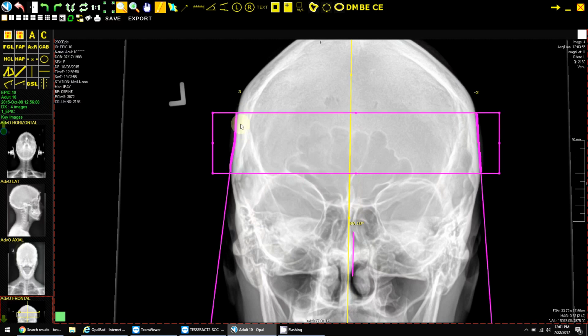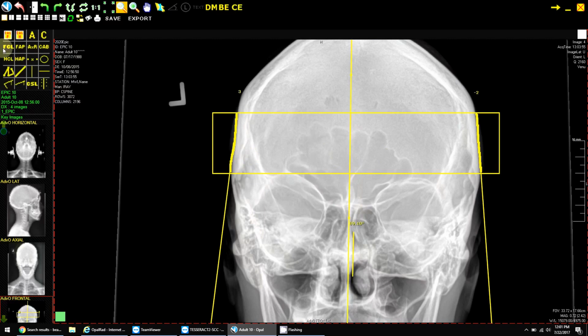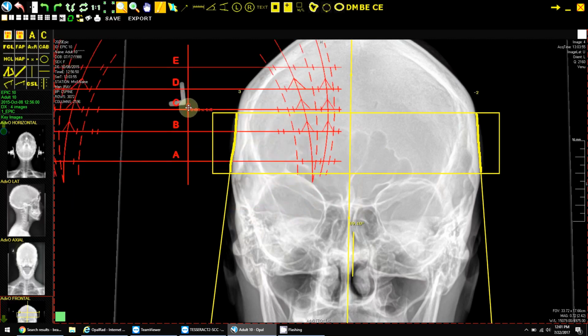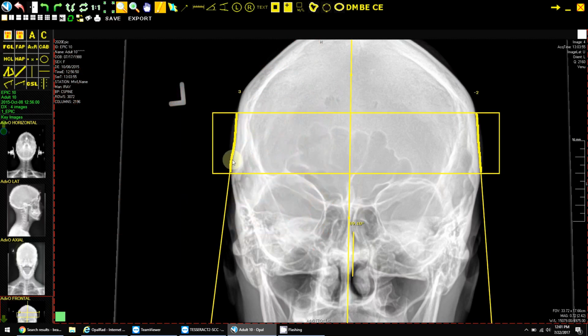You can see with this patient, they have some dents in the skull, and using the old template, which is this guy, right? This is the one that we've used before. That doesn't allow you to actually look for dents in the skull. You have to do this two zoning procedure and such. But with your template, your tool, it actually makes it to where we don't have to do that, which is great. I absolutely love that.